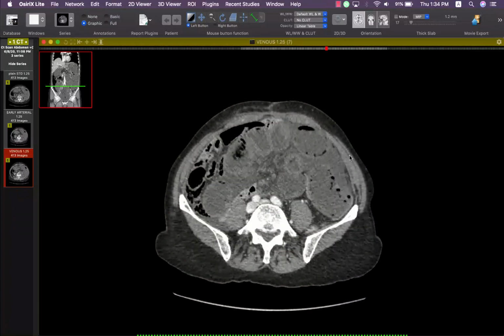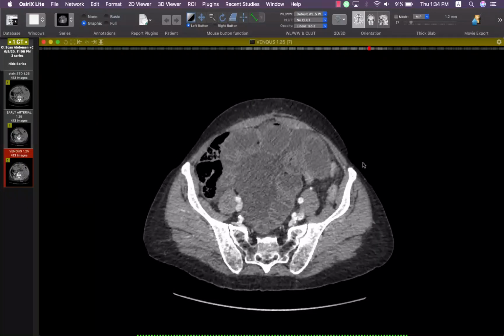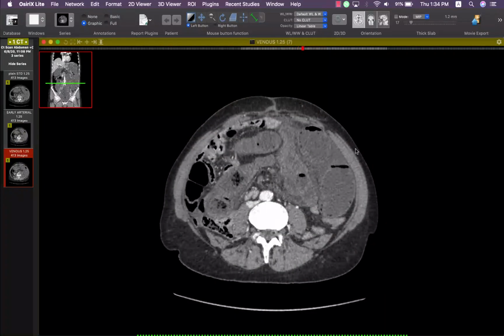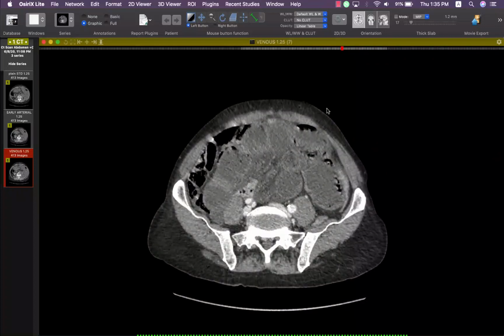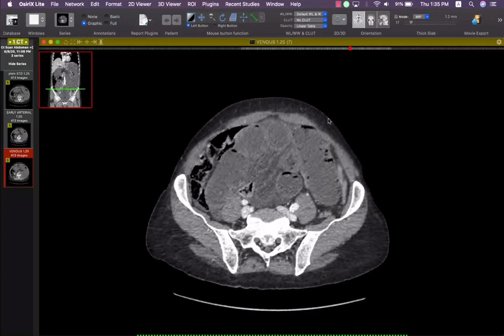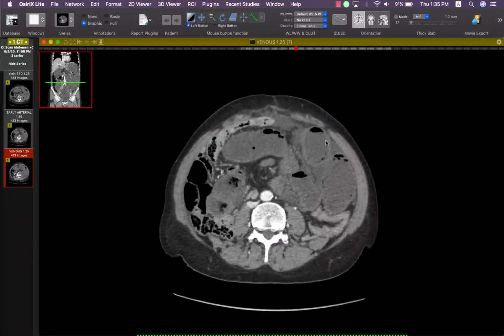If the patient has a history of previous operation, we should put it in the differential diagnosis. And the last cause is internal hernia. The patient here actually has a history of abdominal wall operation before, so the adhesion can be the cause of this internal hernia.